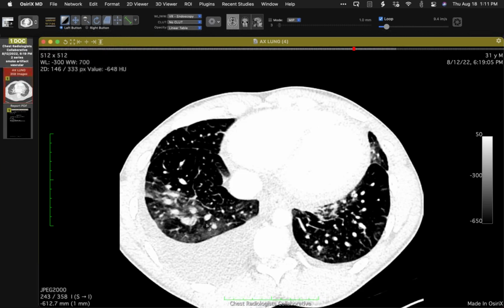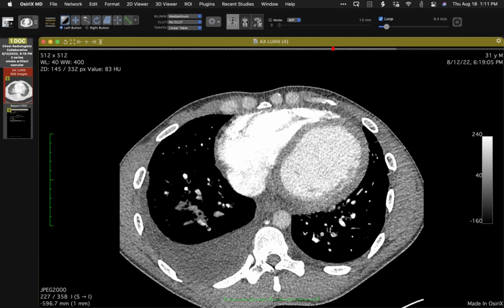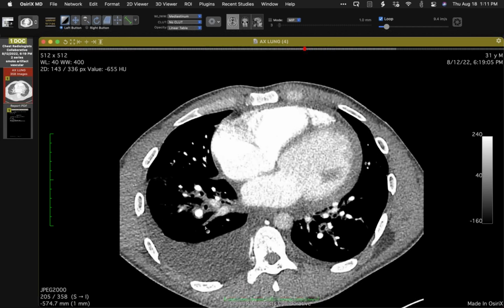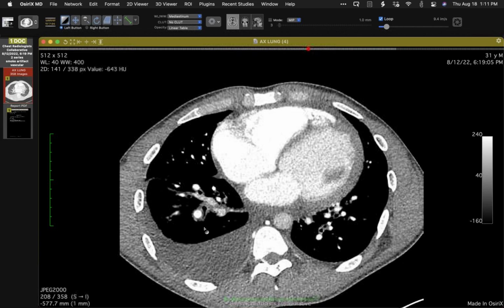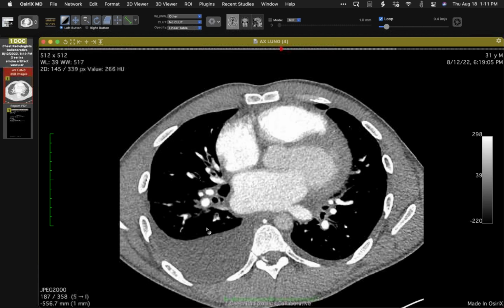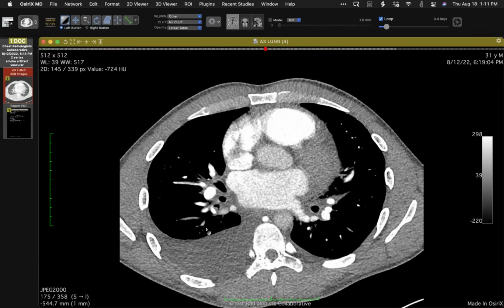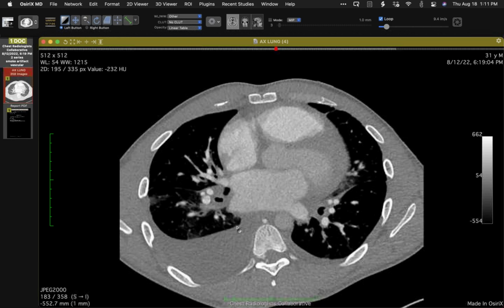So I like to think that the explanation for these findings is the congenital bronchial artery to pulmonary artery communication and the associated flow phenomenon and the black smoke from the relatively unopacified blood coming in via that bronchial artery. What do you think? I think that's a pretty good explanation from that.